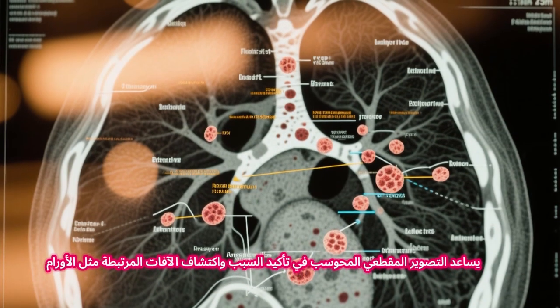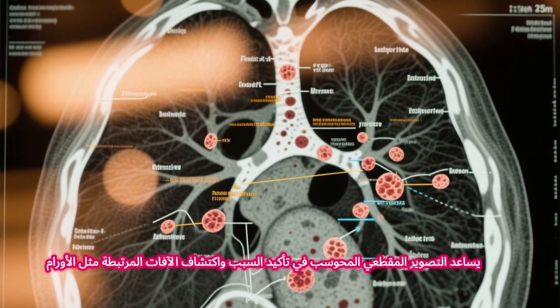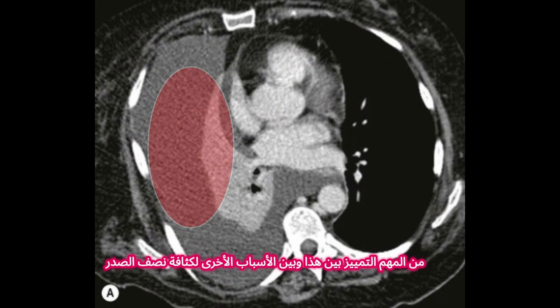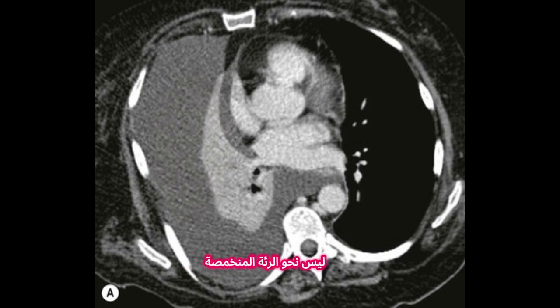CT helps to confirm the cause and detect associated findings like tumors, lymphadenopathy, or endobronchial lesions. It's important to distinguish this from other causes of hemithorax opacity, like pleural effusion, which usually pushes the mediastinum away, not toward the collapsed lung.